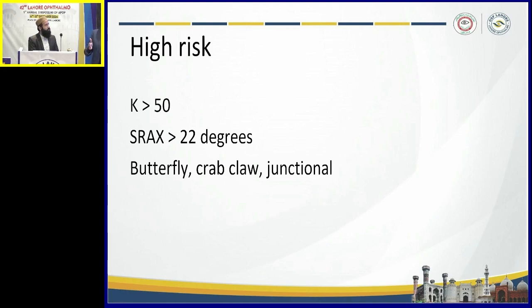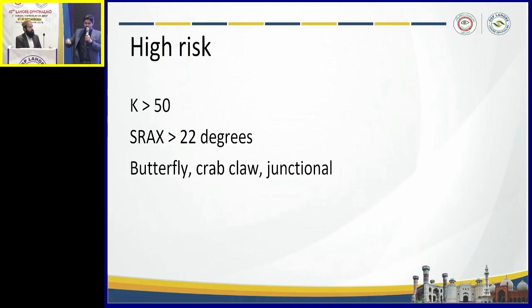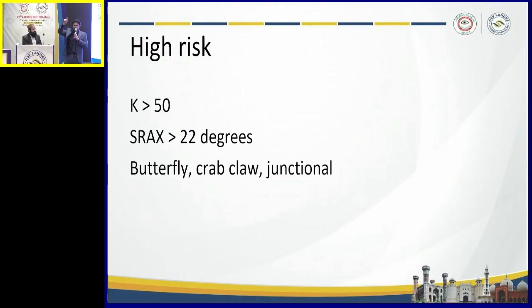There's another map on the Pentacam, it's known as the tangential curvatures. Like I mentioned earlier, sagittal curvature actually takes the radii of curvature of one cornea. It takes two or three points, and it assumes the cornea is spherical from those three points, and then it takes the point from the center of the cornea, right? The radius of that entire cornea.